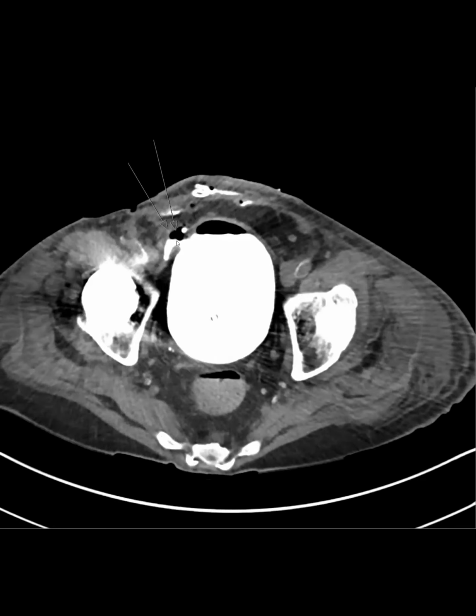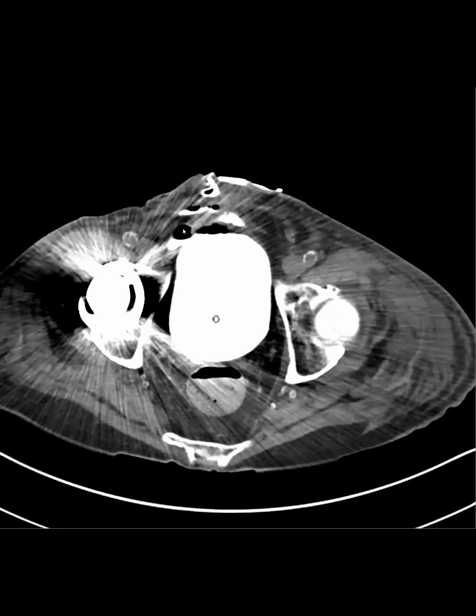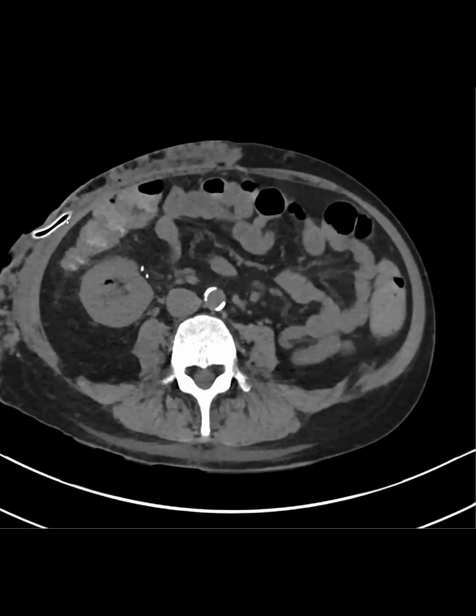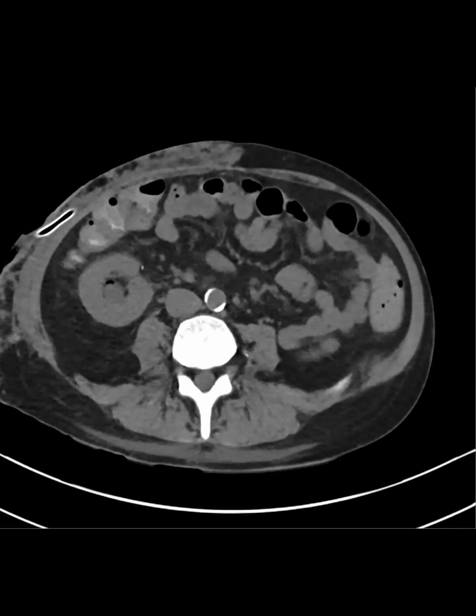And then in this case, for example, all these pancreatic juices eventually eroded the bladder wall and caused this fistula that led to this abdominal wall pancreatic collection and fat necrosis. And I'll just show you.